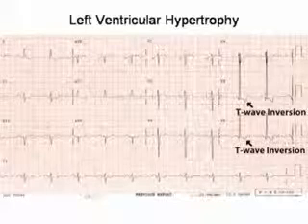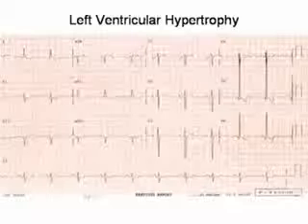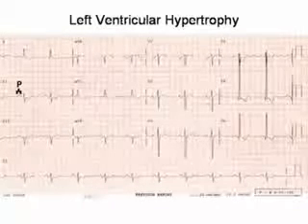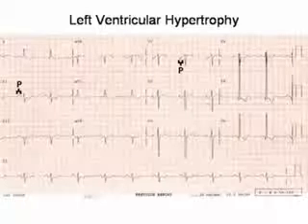Atrial hypertrophy is somewhat harder to look at, but basically for left atrial hypertrophy we look in lead 2, which may be somewhat difficult, but it is 3 small boxes long. And also if you look in lead V1, which is the second criteria, the P wave is mainly negative. The terminology, an increase in the terminal negative deflection, is always rather interesting. Nobody knows what it means, including me.